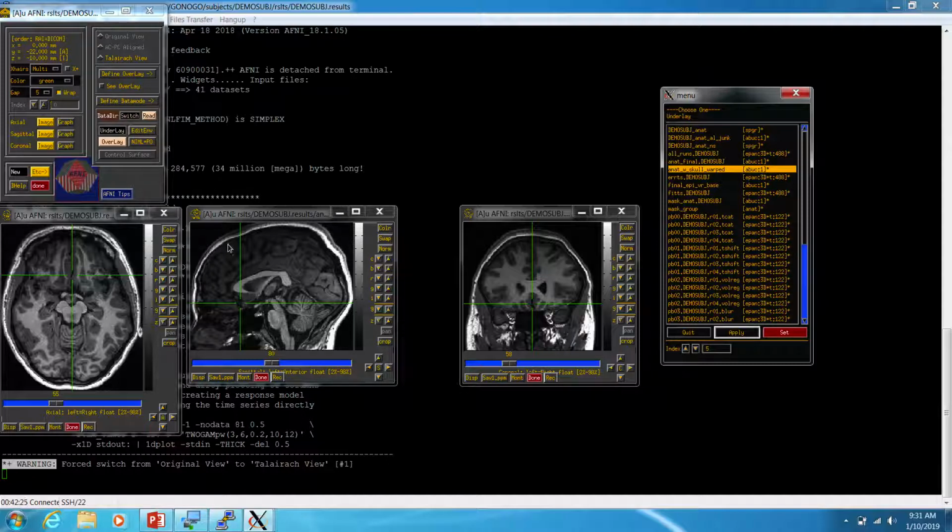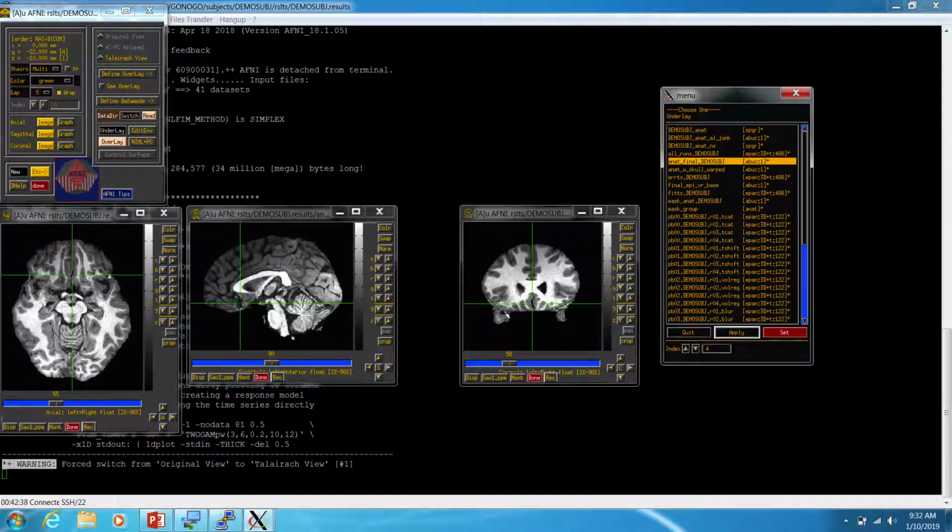So you can tell this image has been warped, but the goal is to just talk about the brain matter. So it doesn't matter that that's a little weird, because that ends up getting then stripped out. And this is this person's anatomy warped into the template space. So it looks really similar to the template space we're using, but this lets you take a look at what's going on. So essentially we end up getting the information from the anatomy files that get warped.